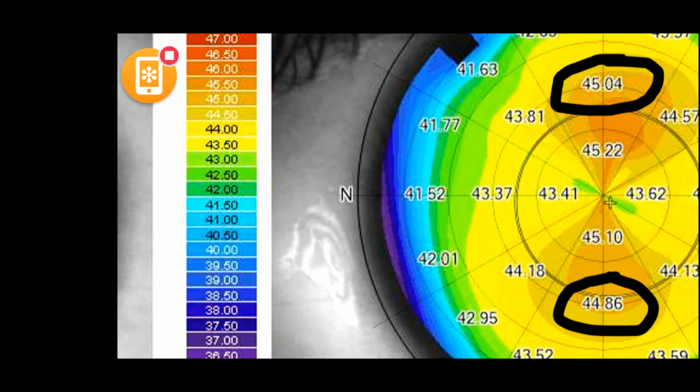If you want some to be steep or flat cornea, I usually like to take 1.5 and 2 diopters of differences. So in a normal cornea, about 2 diopters of difference, I would say is significant. But if the keratometric value is about 47 or more, about 1.5, I would be worried, okay? So I'm looking at the difference in the superior and the inferior rings over here.